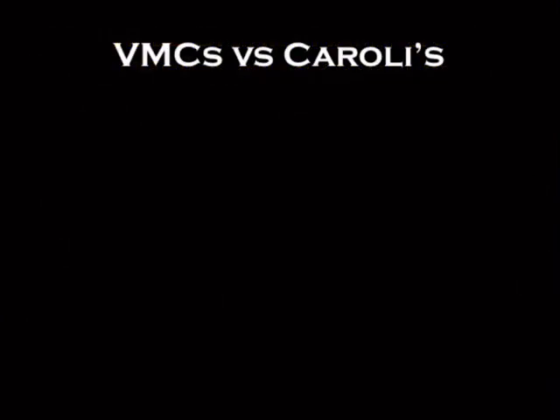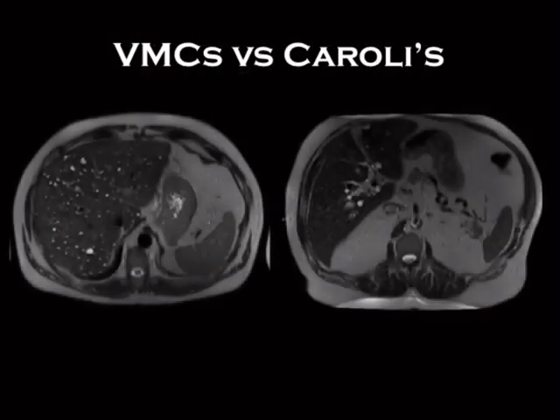So what if they are communicating with the duct? So let's look at the sort of classic this versus that. Over here we've got the case that we just saw with a whole bunch of cystic looking things. And then over here, another T2. You can see right there, they show me a picture where it's communicating with a duct. Look at that right there. That's communicating with a duct. They showed you that. Of course they did. They had to. Otherwise, you can't tell the difference.